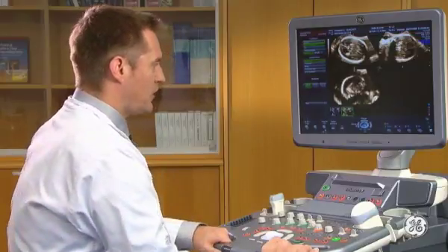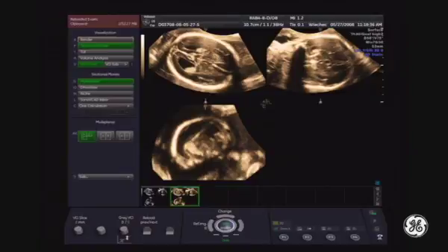In this case, I will present the multiplanar approach to the anomaly of the fetal brain. Let's do the orientation first. So I will bring my pivot point from here to the midline in A plane, and afterwards I will perform some Z rotation to bring the midline horizontally.